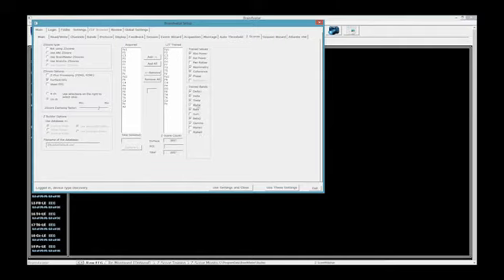Or they'll check off alpha and check on alpha 1 and alpha 2 as independent bands. That's just because you're kind of double training the same band. Even though split apart, they have different numbers that go along with it, you are kind of double training a little bit there. But that right there is the basic overview of Z-score training on a surface level.